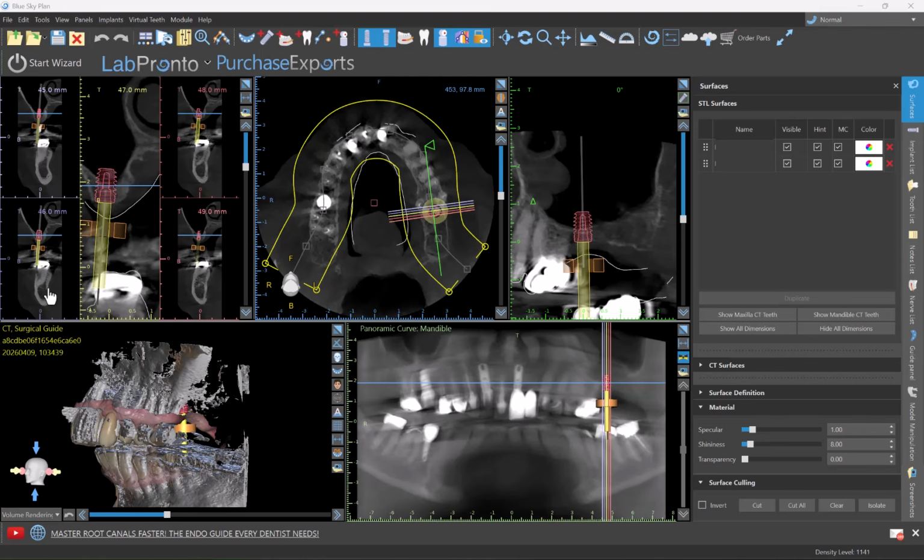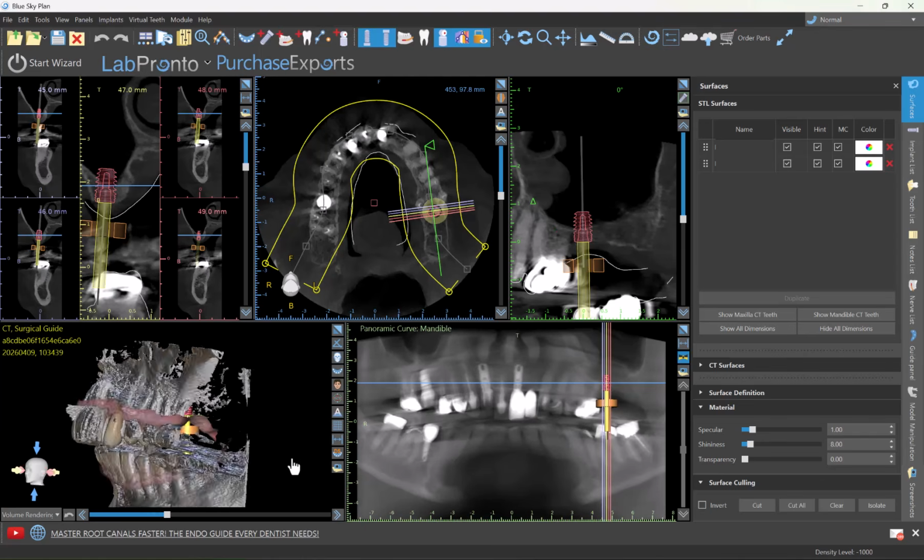Okay, so we can see the case is treatment planned. We're going to assume that it's treatment planned clinically correct and accurately, and we're going to calculate the volume in 3 easy steps. First thing we're going to do is run our completely automatic segmentation functionality.